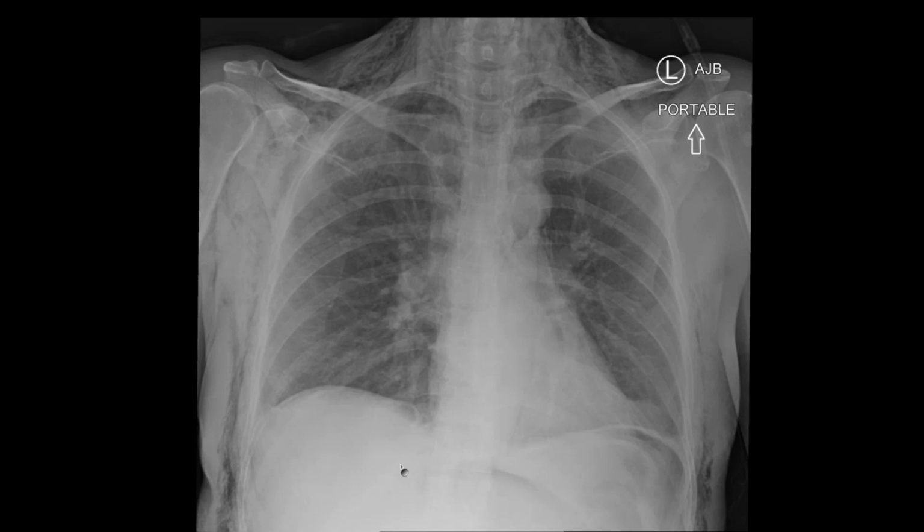that procedure. So of course, there are two possibilities here at least. That is, if some of the carbon dioxide that they introduced to create the space for the lesion resection was in the subcutaneous tissues, that could go up there, of course. But certainly, I think it's quite likely that, and I know by virtue of how much gas they put in reading the op report, that this is in part pneumoretroperitoneum. And certainly air in the retroperitoneal space can certainly go into the chest. So the air could come from this direction, but it could also come from below. So putting everything together, this is very consistent with the sequel of the procedure.